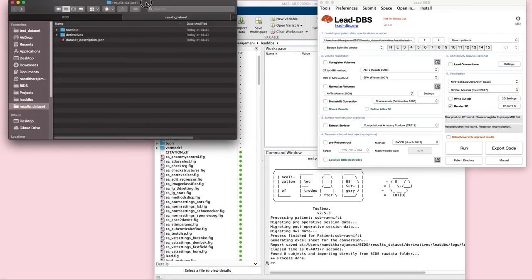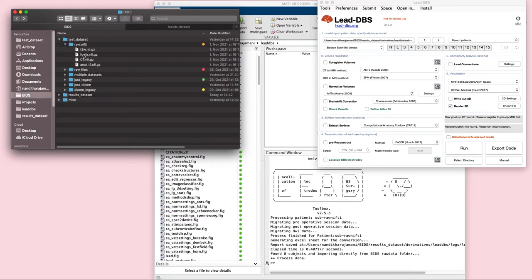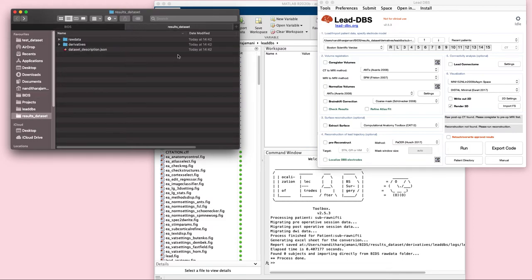So let's also take a look at how our output dataset looks. Initially, just to refresh you, we had a dataset that looks like this, which contains a T2 weighted FLAIR, CT and a T1 weighted image. If you go to the output dataset, you can see that there's a raw dataset containing a subject folder inside.